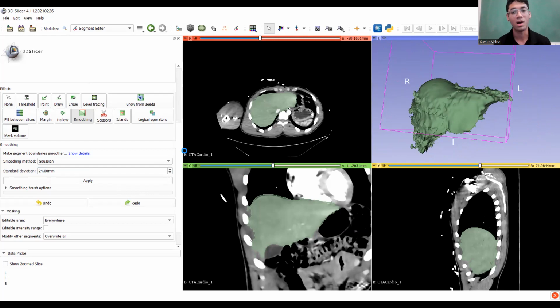And this is going to take a while. I just realized maybe 24 was a little much. I'm not sure if my computer can handle that, but we're going to see what happens. Oh boy. And now I'm wishing I saved it. Dang it.